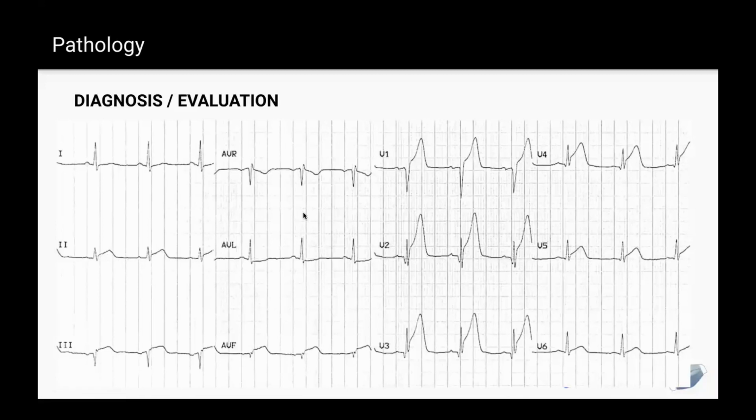Cole says 2, 3, and 4. I have to agree with that. So I would even say 1 as well. Remember we called these tombstones, it kind of looks like it goes right from this Q complex, all the way up and forms a huge peak here. So I would safely say V1, 2, 3, and 4 are my big ones.